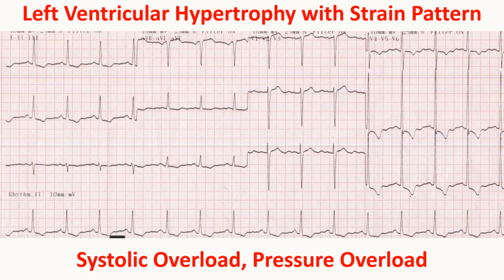There is also a diastolic overload pattern in which the tall R wave will be there and there may be a small initial Q wave, narrow Q wave will be there in diastolic overload. Typical condition in which diastolic overload is seen is severe aortic regurgitation. It can also occur in large patent ductus arteriosus. So a small Q may be seen there.